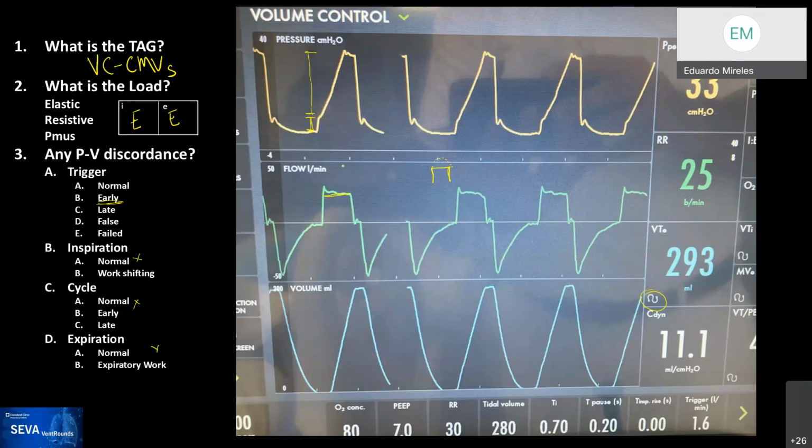in terms of flow. But Rob does bring a very good point. So you see how the waveform actually has these little changes; it's not a straight slope. There is this pretty acute change, and then you can see it probably here again, right there, an acute change, and then this one looks concave. Usually that's a marker of over distension, right? That's something that we would see under these circumstances. That may be of concern.